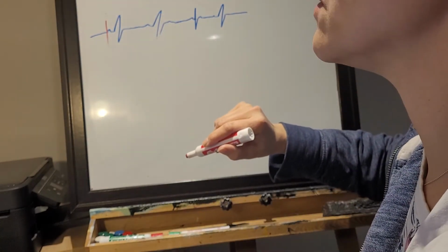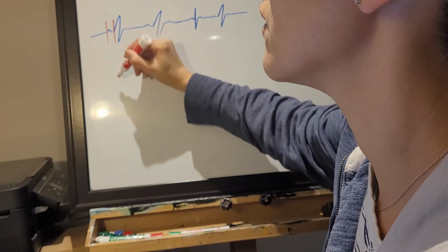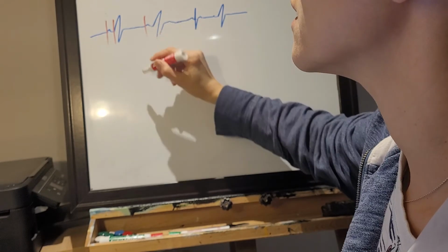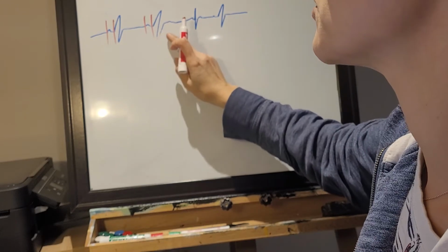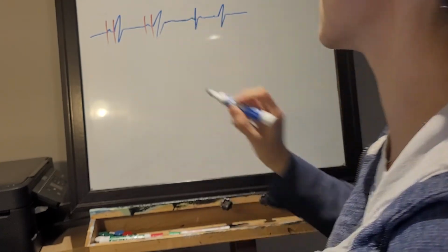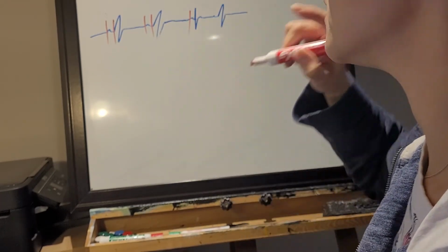So that's the atrial lead firing. So I'm assuming a dual chamber pacemaker here. So the atrial lead fires and captures. Then the ventricle lead will fire and capture because that's wide. Assume that's wide. And then again, it'll fire and capture the atrium. And then again, fire and capture the ventricle. I'll make that a little bit flatter so that it doesn't confuse anybody. I don't want to put an extra deflection in there to create problems. And then again, I fire.